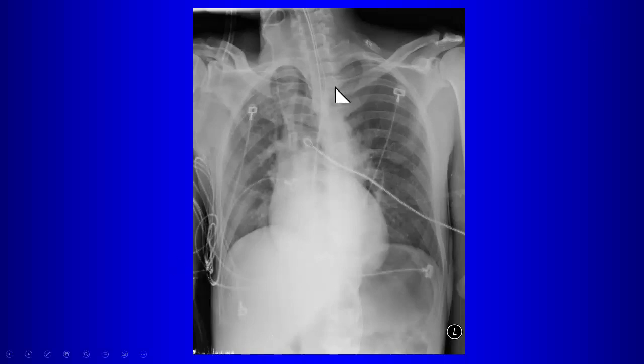So we can judge that. We look for the clavicular heads relative to the spinous process. Where that is closer, that part of that shoulder is rotated towards you. Okay, so it's a right posterior oblique projection. Anything else? Any other observations? We're just going to dictate this. No consolidations, right posterior oblique, next case. Are we done?